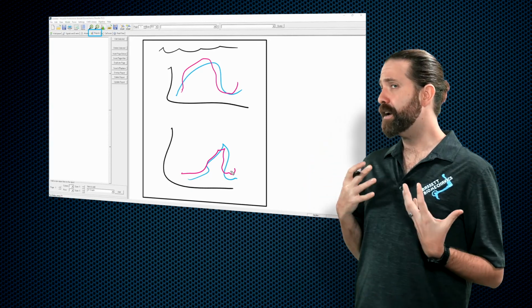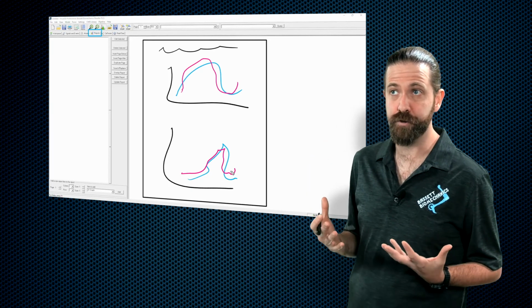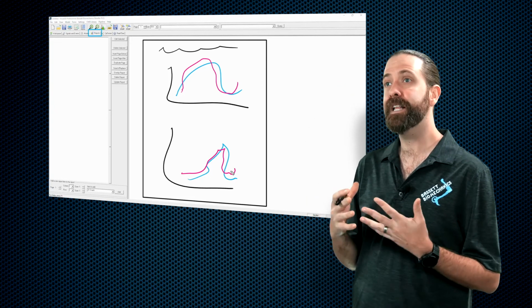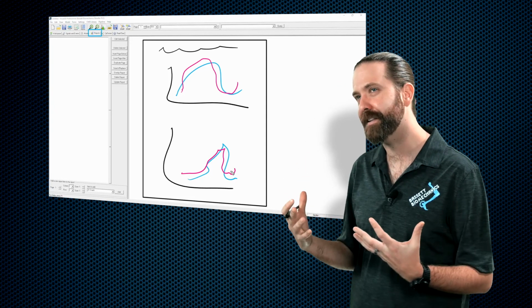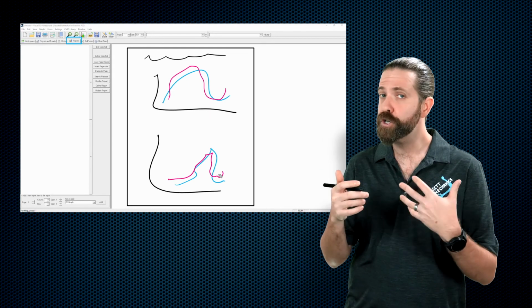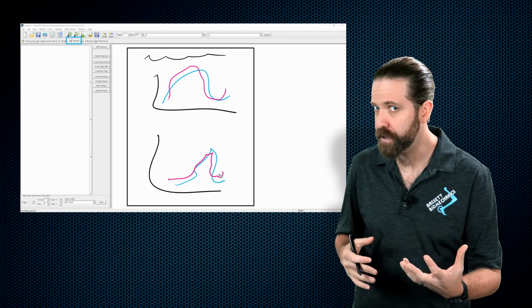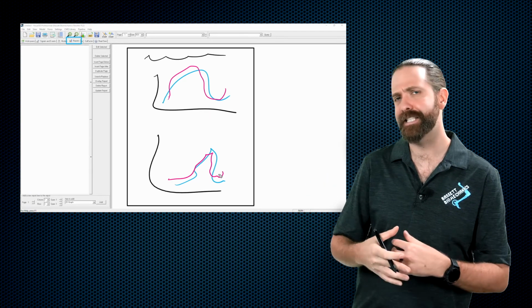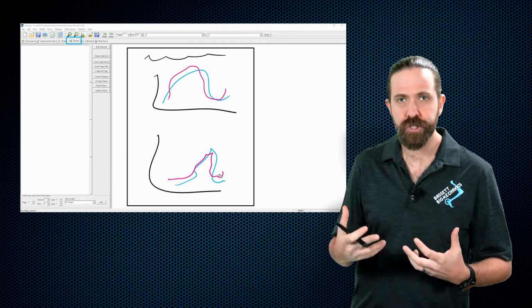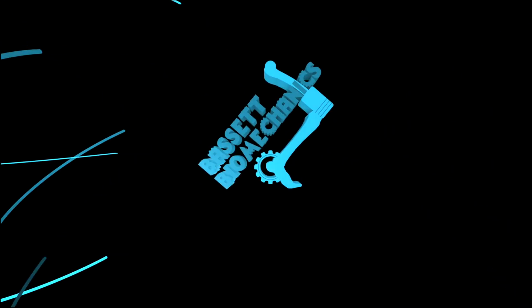Now that you have a bit of an idea of everything that you can do in Visual 3D and what it looks like, let's start actually doing things. So in the next chapter of Visual 3D Basics, we are going to show you how to open files for the first time and a calibration file, and show you where everything ends up so that you can start building your biomechanical model.